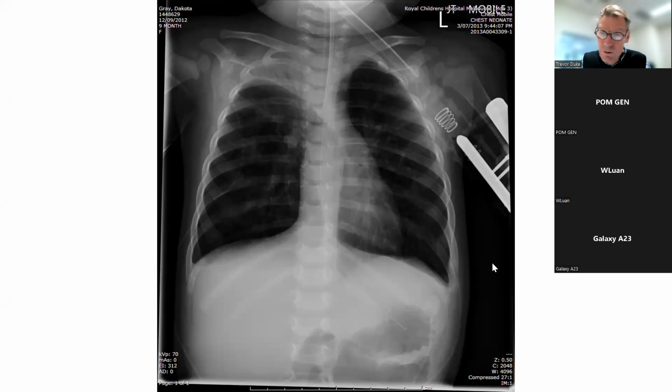A common reason, and sometimes we see X-rays in these children, but we don't notice the abnormality. But I'll tell you, if you see a child who's got severe dehydration, and they're hypovolemic, then often when you look at their chest X-ray, their heart will appear small and their lung fields will appear very black. The reason for that is their heart is not filled with fluid. It's a bit empty. It's not completely empty, because otherwise the child wouldn't have a cardiac output, but it's more empty than it should be if you see a child who's got severe hypovolemia.